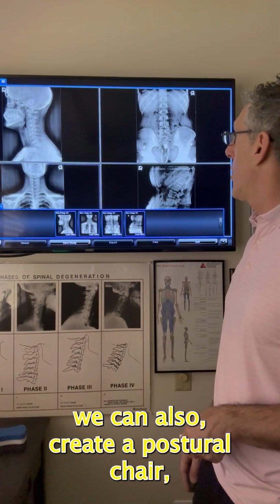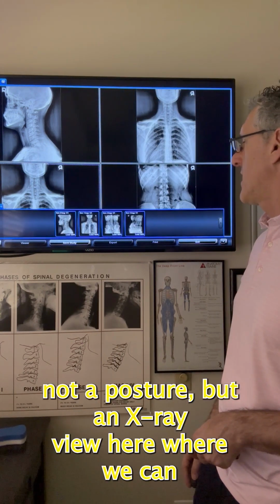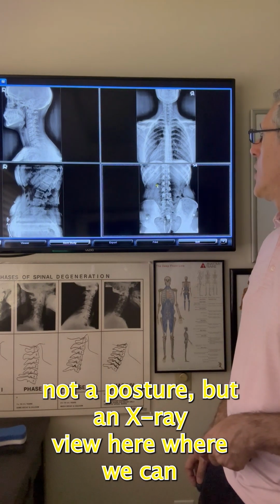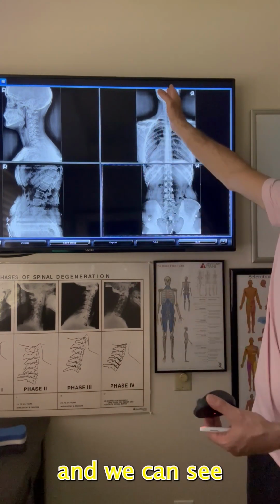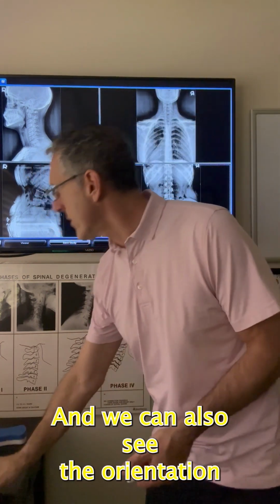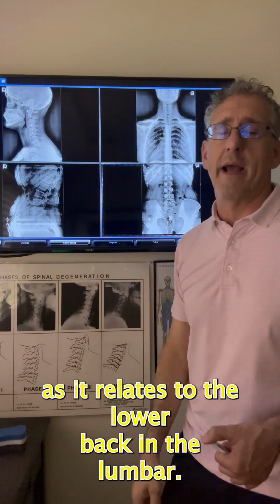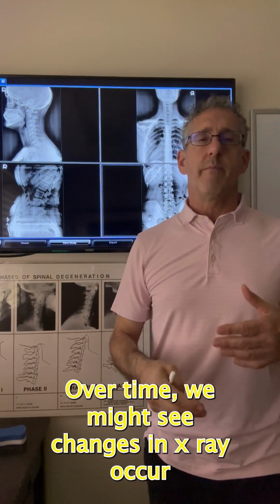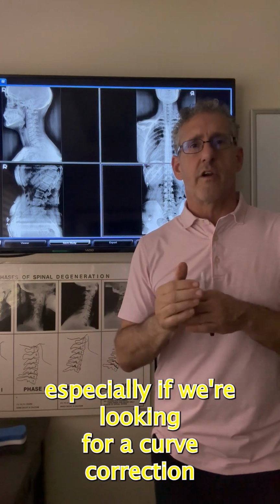We can also create an X-ray view here where we can look at the film from top to bottom, and we can see the orientation of the head as it relates to the sacrum. And we can also see the orientation of the cervical curve as it relates to the lower back and the lumbar. Over time, we might see changes in X-ray occur with treatment, especially if we're looking for curve correction.